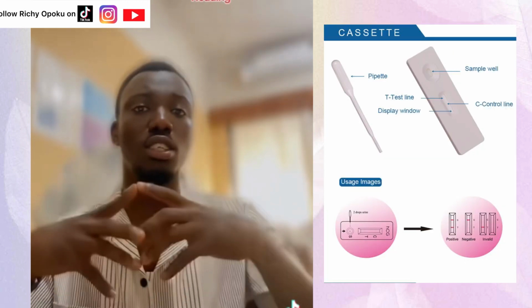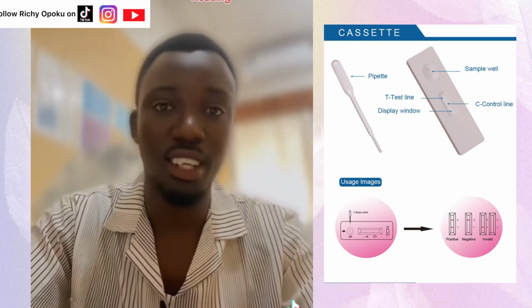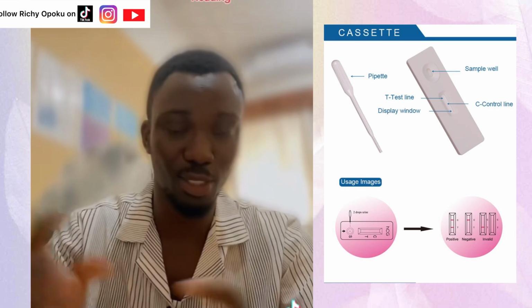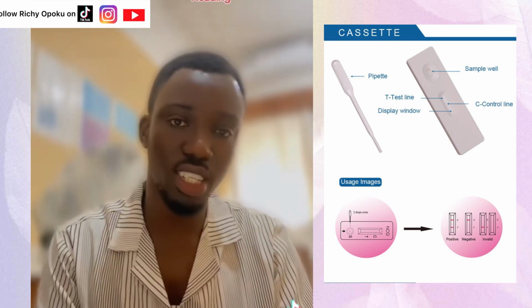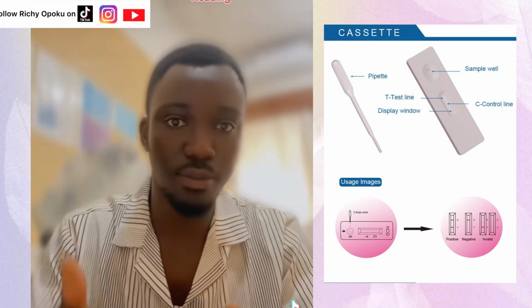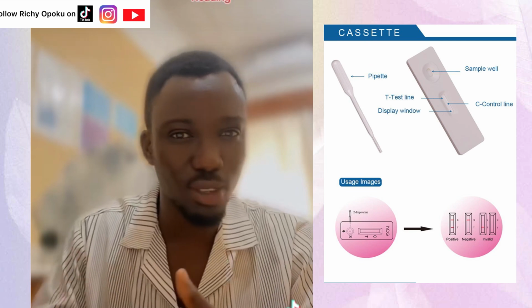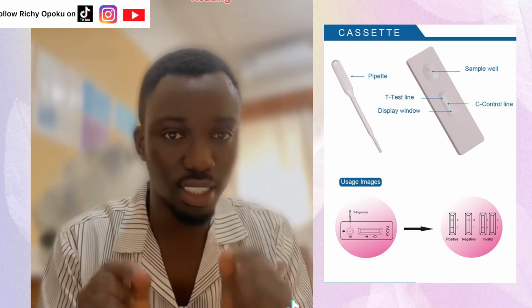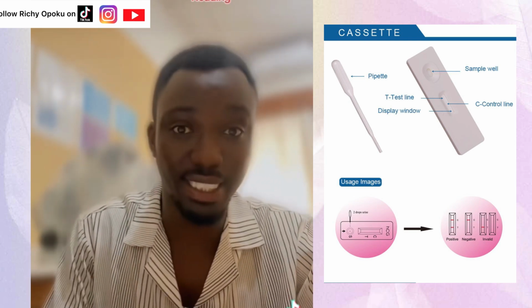Thank you. So when you take the pregnancy strip or cassette, it has various parts. Let's take a few minutes to talk about the parts. We have the sample well where you put the urine. At the other end, we have where you read the results, and over there are some letters. The one closer to the well is T. The one far from the well at the other end is C. You can look at the picture there.